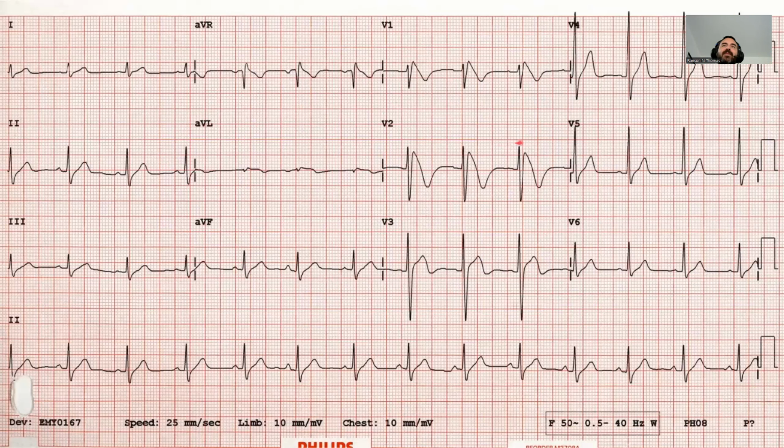So from one electrode to the next. In some of them, because of the orientation of the electrode and because of the way the conduction is happening in the heart, it's going to show different magnitudes for the electricity that's being transmitted. So again, you don't need to necessarily memorize what all these different leads look like in terms of their magnitudes. That's why I focus more on the length of the waveforms, because that is going to be consistent.